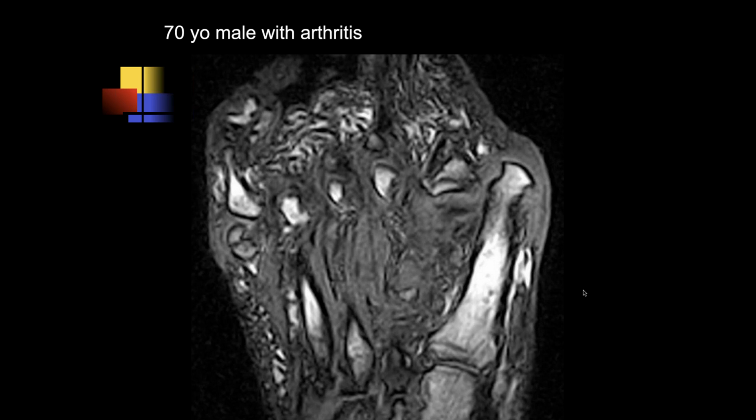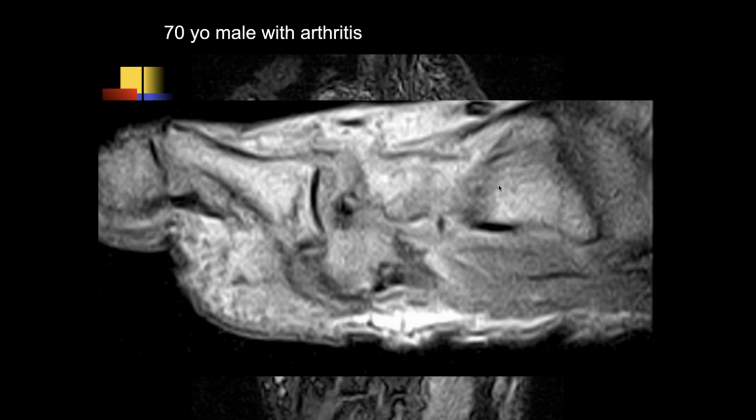We try to repair a lot of them. Usually you wind up amputating. So here we can see medial dislocation of the great toe proximal phalanx with respect to the metatarsal head. And there's surrounding soft tissue thickening, probably chronic synovial thickening and synovitis. I guess this could be inflammatory arthritis or it could be gout.